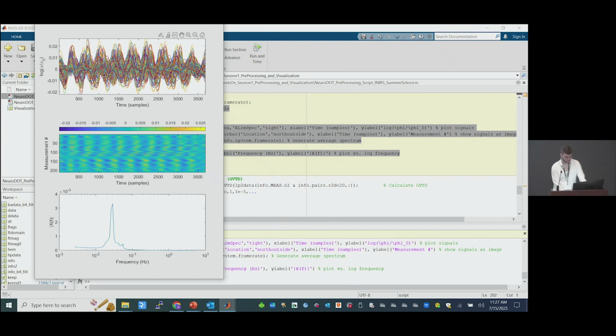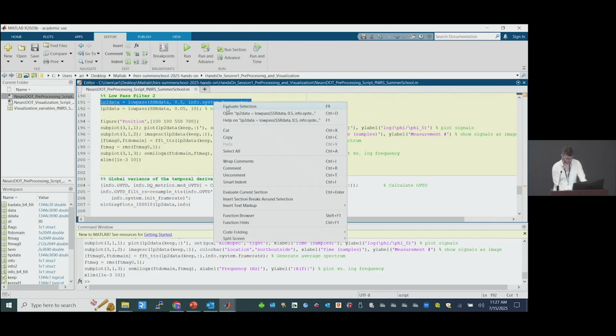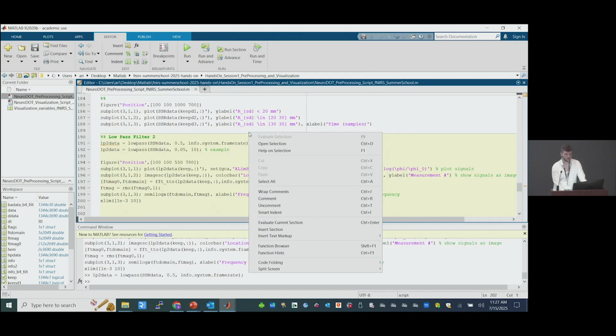We've got crazy sinusoidal measurements now in our raw data plots. All right, so I'm going to go back to our standard one of 0.5 for the rest of this. But I encourage you, if there's any point in time where you want to break off from what I'm doing and use your own cutoff frequencies for any of this, please, by all means, go ahead.